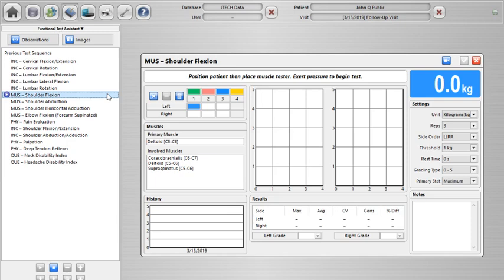However, one large segment of our market included functional testing. So this is occupational medicine, industrial medicine, things where you're really trying to observe function, but also document things like high effort behaviors or painful responses. I want to draw your attention to the left-hand side where we have a couple of icons here for observations, the eyeball, and then we also have an images with the little camera.